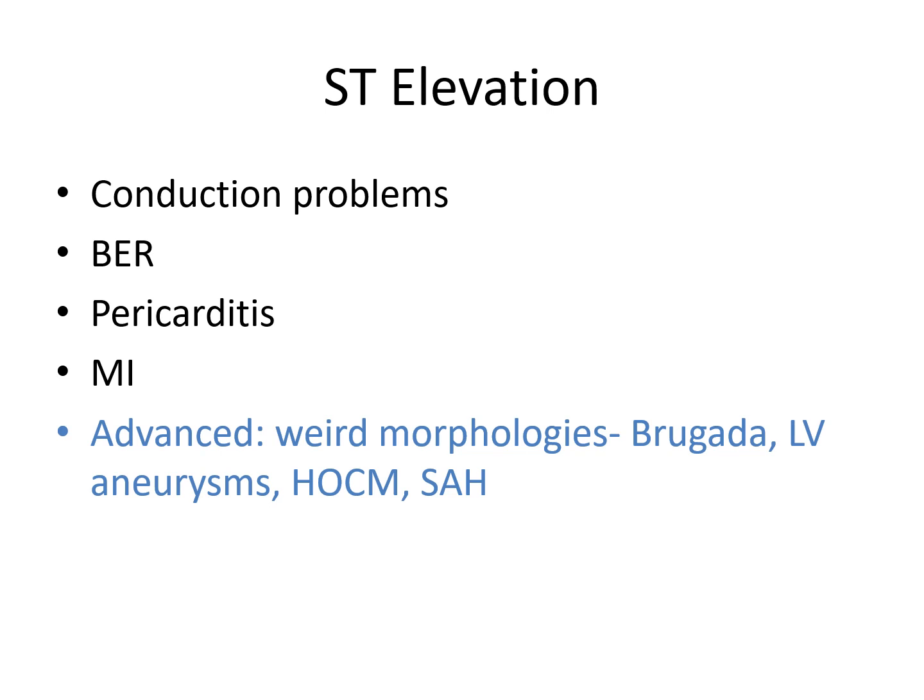ST elevation also has its checklist. And just like in ST depression, the first job would be to do the analysis for hypertrophy and block, because they can lead to appropriately discordant ST elevations. And then there are two more benign conditions outside of a STEMI that cause ST elevations. The first one is benign early repolarization, then pericarditis, and finally ST elevation MI.